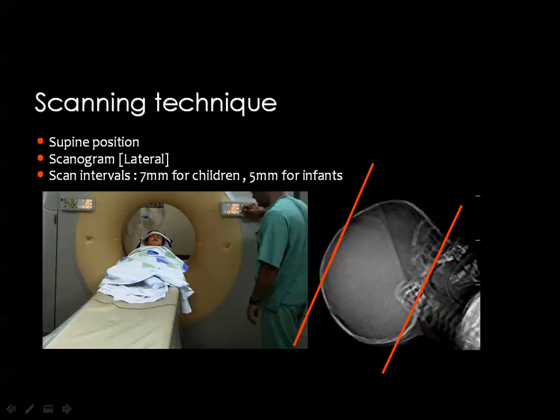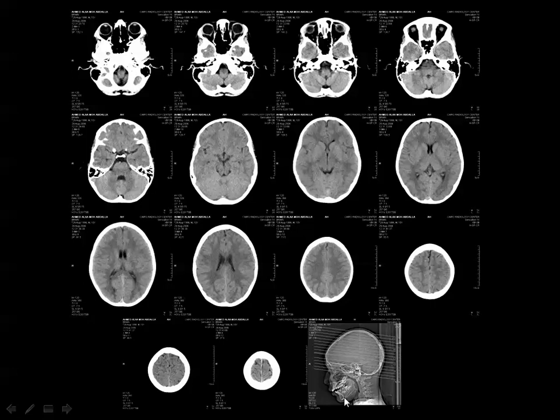so that you are able to see the anatomic structures. I will show it to you. Then you know the anatomy as well as the pathology if you tried to adjust this line at the orbitomeatal line. If not, we usually scan the skull from the base to the vertex according to the alignment we are able to obtain. Then after scanning, we will have these sections. The first at the skull base, and they will proceed superiorly until we reach the vertex of the skull.